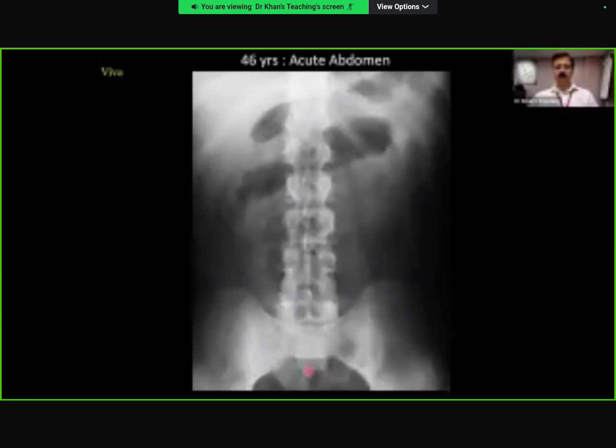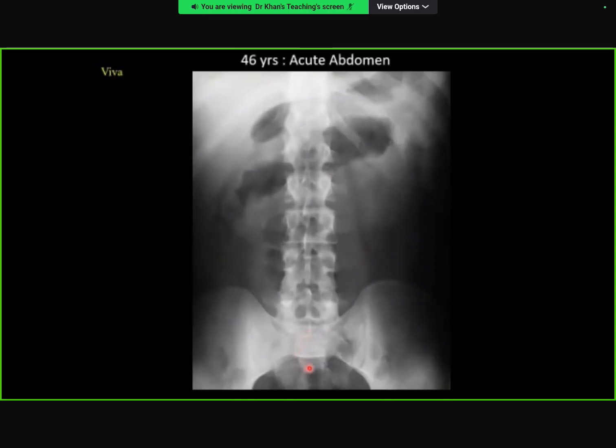You have concluded correctly, but how have you concluded that? So the mucosa appears a bit irregular and thickened compared to usual. Mm-hmm. And the irregularity combined with the abnormal thickening. Okay, that's fine. I'll take over.